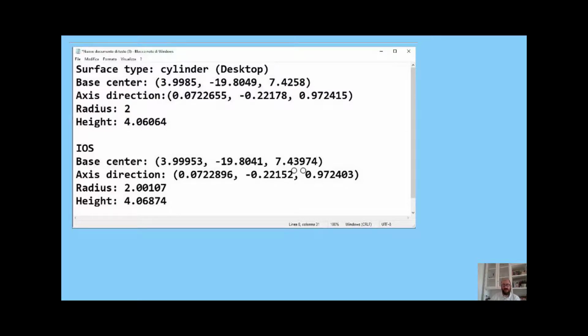In view of all this, I can confirm that there are no substantial differences or deviations in working with the desktop scanner or the intraoral scanner provided by Shining 3D for an implant job.